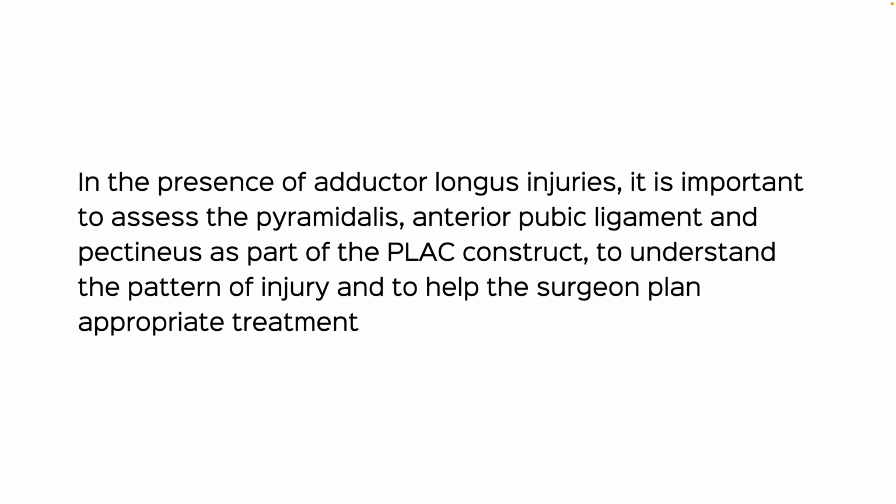And if we know in advance, then plan it in such a way that the axial scan plane is perpendicular to the plane of the pubic bone, and then plan the sagittal and coronal accordingly, and then figure out where this all fits into in terms of the pattern of injury, but use the 3-step process.